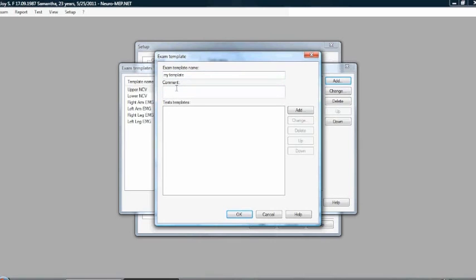Now, I'm going to say this is going to be Dr. Smith's template, so that she doesn't take your template, you don't take her template. Okay? This way, each time this comes up, let's call it here Smith's template to make it even easier. Here we go.